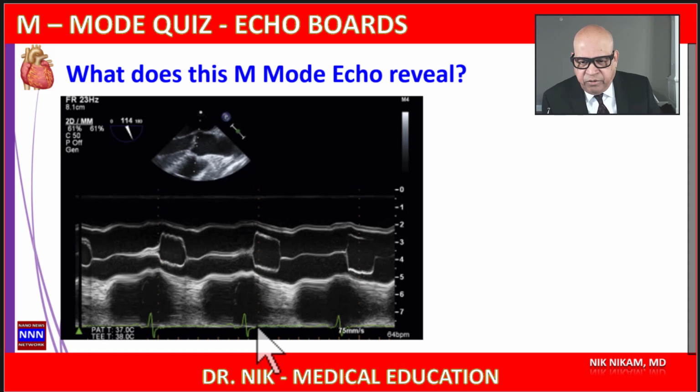The other point I want to bring to your attention is the aortic valve opens briskly, it stays open during systole, and it abruptly closes. There are many situations where we are going to see variations of the aortic leaflet opening and closure along with the changes in systolic phase that will help us to identify.